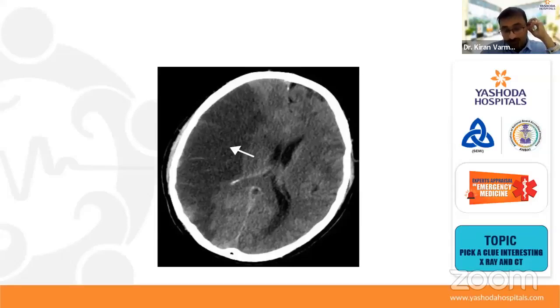Okay. Then how does infarct or ischemia appear in the DW scan of MRI? Quite in contrast to the CT scan. In CT it is hypodense, then in MRI it is hyperintense. Okay, clear? So history and clinical examination and CT findings.